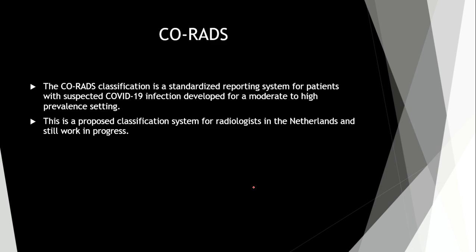And you know, now we are in the middle of the COVID-19 pandemic, so I think it is very important to show you the CO-RADS classification, because you can meet it anywhere, and I feel guilty if I didn't give it to you.